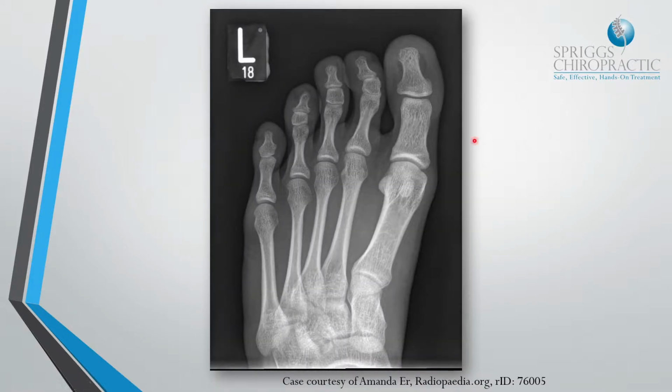Obviously you can take them as a group, where you can evaluate all of the metatarsals and the phalangeal bones all together. It's a very, very helpful way of doing this. As you can see on here, this little toe only has proximal and distal phalanges, the same as the big toe, whereas the middle three have three. Some people do still have three phalanges on the little toe. It depends on the normal radiographic appearance of those patients. So some people will, but some people won't. The big toe is standard, where you've only got the two.